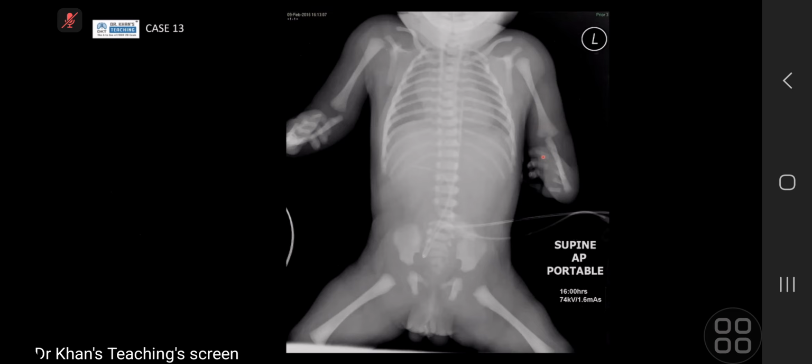For this radiograph, I don't see any gas bubble, any gas shadow in the abdomen. And also I see there is some linear tubular structure in the upper part of the esophagus. So I am going with complete esophageal atresia without fistula.